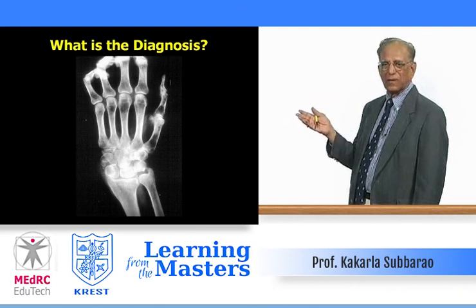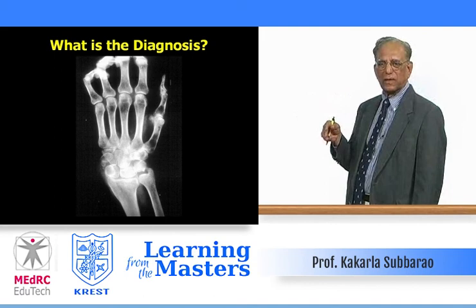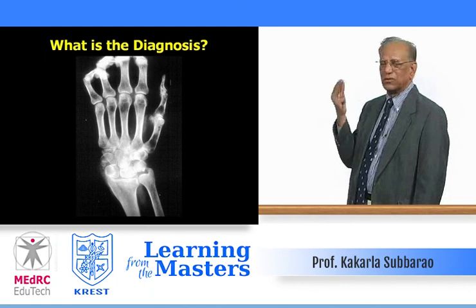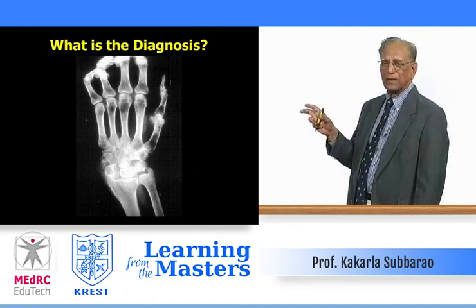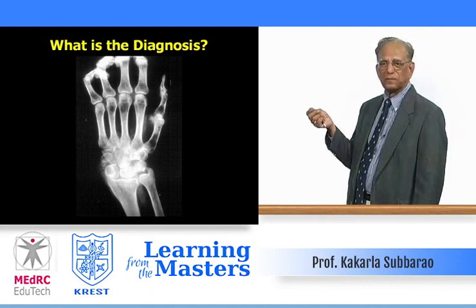This is because the patient had a traumatic disarticulation, and the doctor wanted to reimplant it. In reimplantation, he has missed and reversed the hand and fixed it to the forearm. You understand the whole problem. It is a miscalculation or misunderstanding. He reversed the hand and stitched it to the forearm. That's the diagnosis.